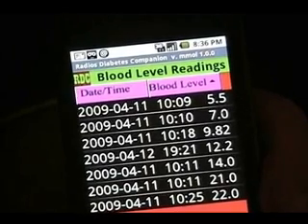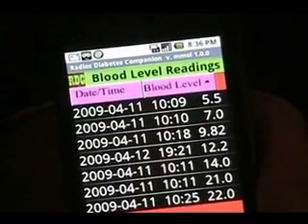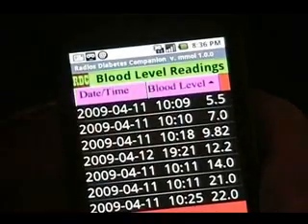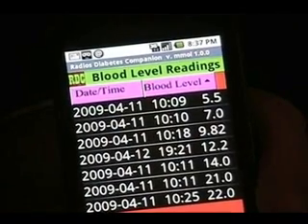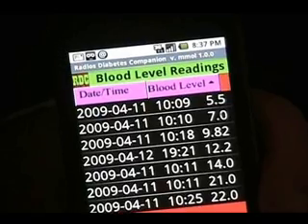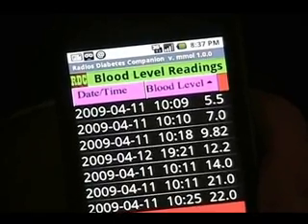Okay, what have we got here? If you go here and here, now this is basic caregiver mode. Now, even though I have hundreds here in this entry, it is not recommended. It's best to do it in tens. I just wanted to make sure I wouldn't cause an error or anything. Sorry. And when you work on the levels, it's very good.